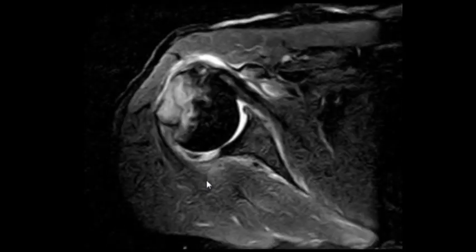Look at the shape of the fracture. It's an indentation rather than a comminuted fracture, a V-shaped indentation. So what causes this type of specific indentation fracture? If something is indenting it from outside, pressing on it, then there will be this kind of fracture. So this fracture is called a Hill-Sachs lesion, definitely. And whenever you see a Hill-Sachs lesion, you should look for a Bankart lesion.